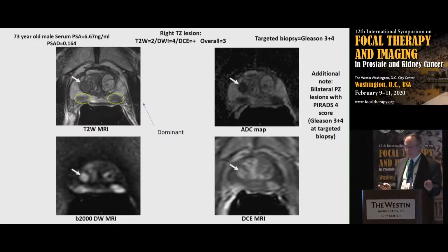Then this is another scenario that I want to bring up. We have definitive lesions here in the peripheral zone. There's no question about that. There are 4s, and they're going to get biopsied. But then you also have this lesion, which looks like it could be a BPH nodule, but it is homogeneous, low signal, very characteristic on the non-dominant sequence, and it enhances. And because of the enhancement, if you're calling this a 3 because of its features, then it upgrades, or it could upgrade.